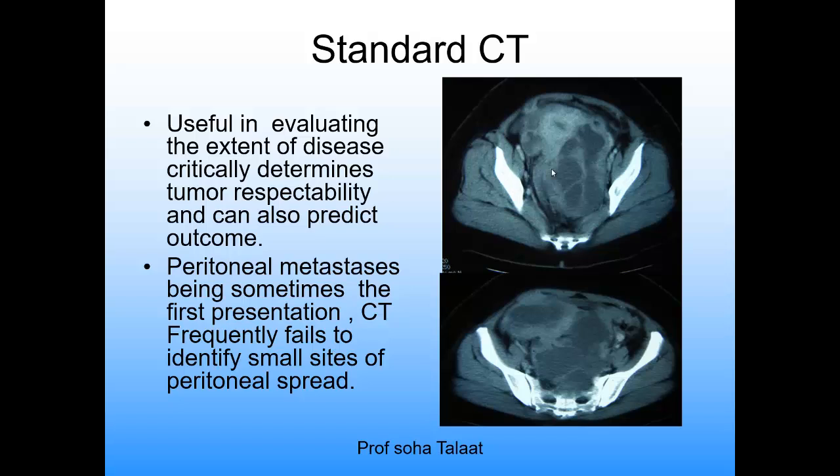Like this case, known to be bilateral malignant ovarian. We have here all the criteria of malignancy. It is bilateral, more on the left side. We have thick septations, a thickened wall, and enhancing solid components. So this is a malignant lesion. This is O-RADS 5.